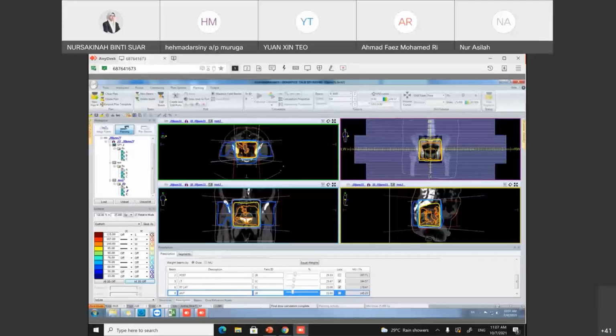So with this type of patient, you will need to play more with the weighting. Now, how should I make the 60% equal? As I mentioned just now, I already dumped the right lateral dose to others, but now I want to make it more equal, or make it more for the box. I want to make the 60% in the box fill more homogeneous. How can I do it?